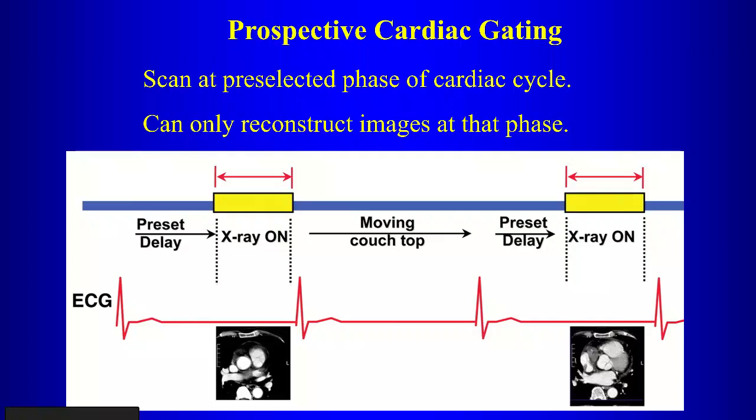What are you doing on those images? How? What did I say? It's brainless, right? You're circling the vessels. The software, though, is taking your measurements. And the most common scoring system that is used is the Agatston scoring system, right?